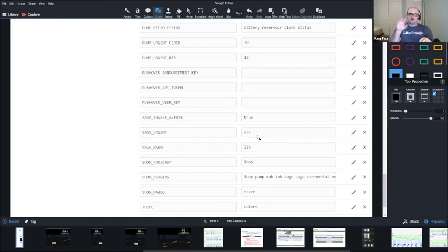It will make an alarm on Nightscout, and it'll tell me that the sensor is about to expire or something like that. So I have 2 different warnings that show up on day 9 of the sensor to let me know that it's expiring in case for some reason I didn't know that was happening. So for those of you that wish you had a sensor expiring warning in Dexcom Follow, this is how you get it. You do it in Nightscout.